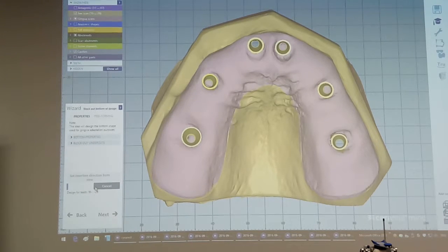And then we will generate the bottom of the abutment, of the gingiva. This means we also have to protect the surface with a thin layer with 30 microns around here.